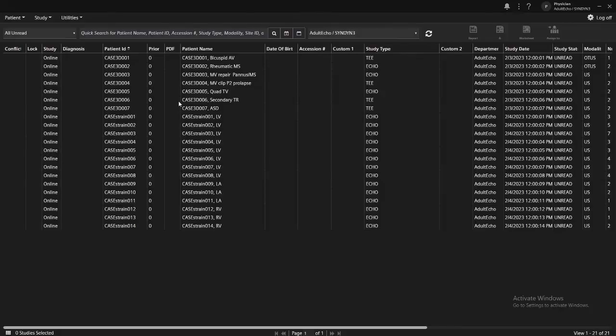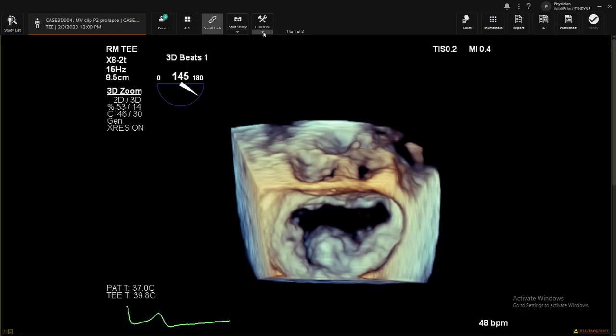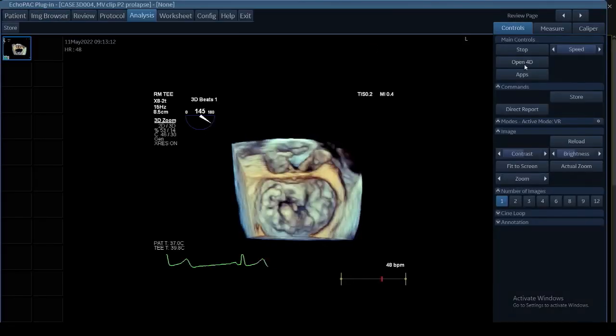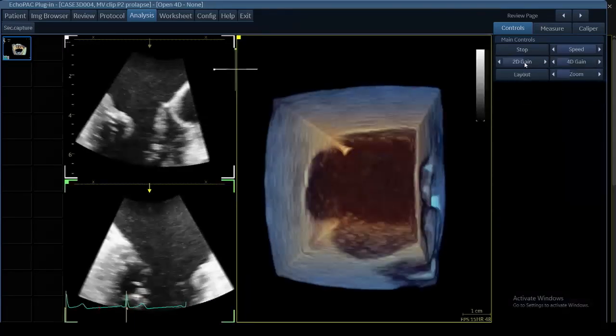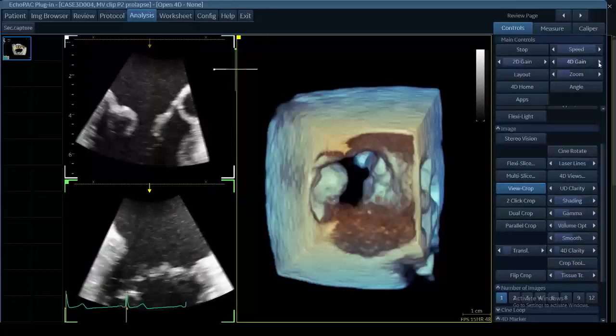Or is it translate or translocate? The translate: once you've set up your 3D cropping plane, translate will just move that plane in one direction or the other. So sometimes you've got your cropping plane set up, and then you're like, oh, I wish I had cropped a little bit closer to the structure. If you hit the translate button, it'll either move it a little bit closer or a little bit farther.